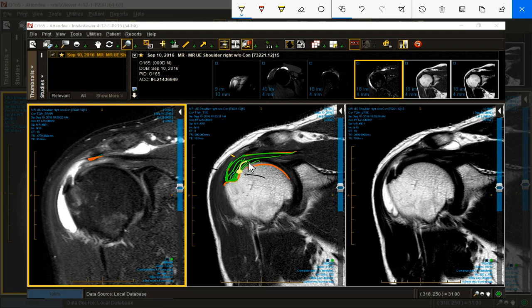It stays on land. Now, it is an articular surface lesion with interstitial extension, a partial articular sided tear with interstitial extension called a paint lesion.